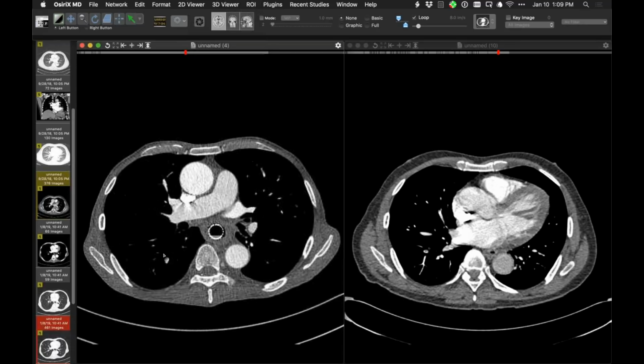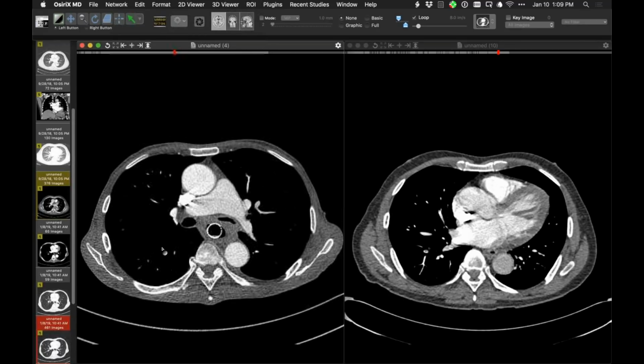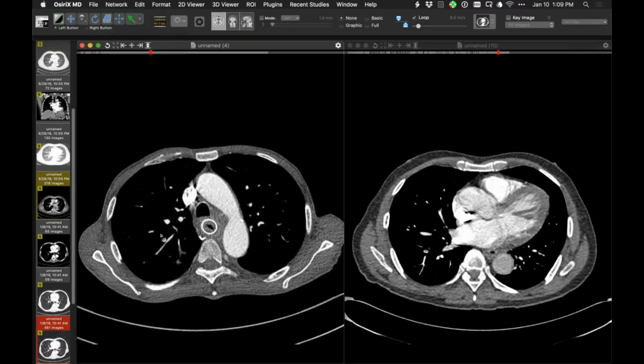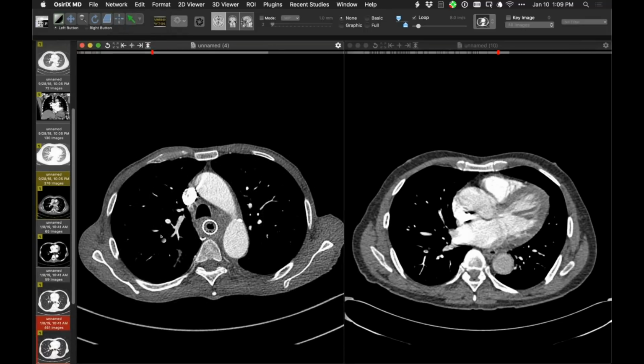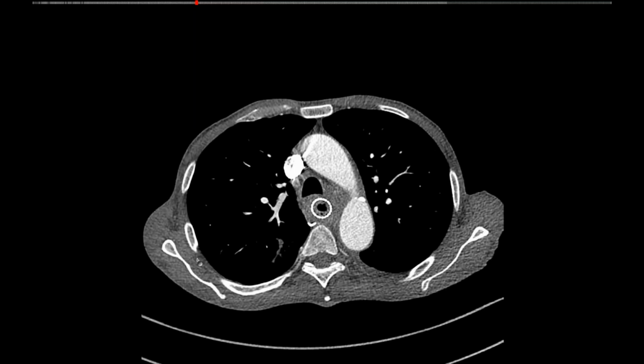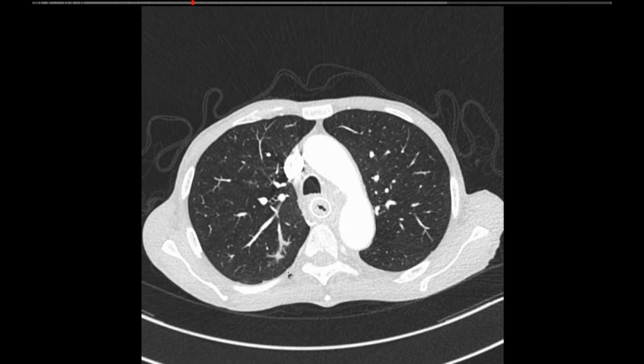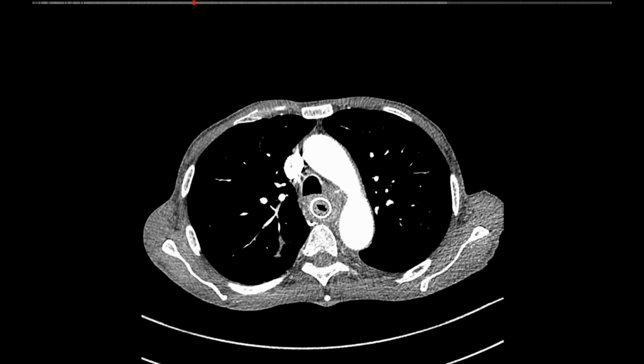And there are other ones like that, actually, in other places too. The esophageal stent is a nice clue on the same images too, of where the source is. Yeah. And you have the pitfall of thinking this is related to aspiration, so it's important to make the observations you pointed out about the intravascular component. Yeah. Just look at this one over here. I don't think I showed you that one. Look at that one. Yeah.